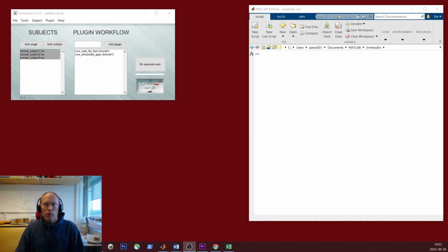In this tutorial we will look at the pupil analysis, and I will look at the pupillary light reflex, the PLR, but you can use the same tools to do pupil dilation analysis. I will start where I stopped the second tutorial. I've got 3 subjects with data files from Tobii ProLab.